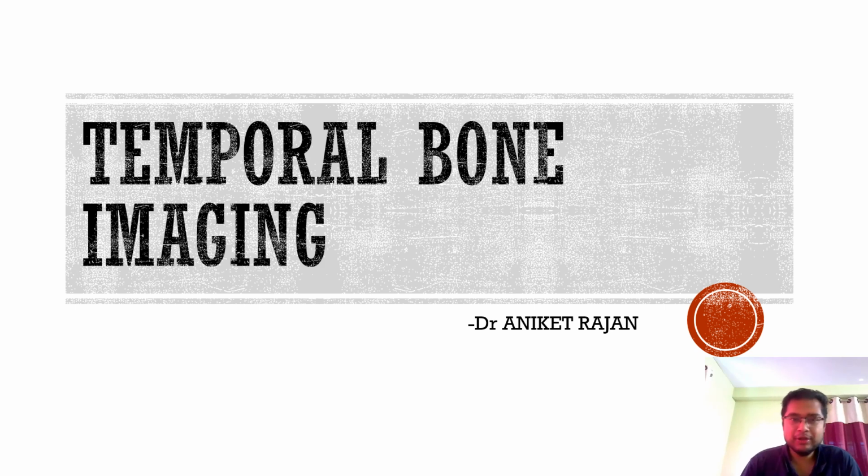So hello everyone and welcome to this extremely important session on temporal bone imaging, where I'll be taking you through some of the interesting cases of the middle and the inner ear. Although it's very important to understand the anatomy of the temporal bone first to actually diagnose any pathology, I'll not be covering the entire anatomy in this particular session, because that is for you to sit in the console room and do it for yourself. But I'll be covering the relevant anatomy along with the pathology during the imaging.